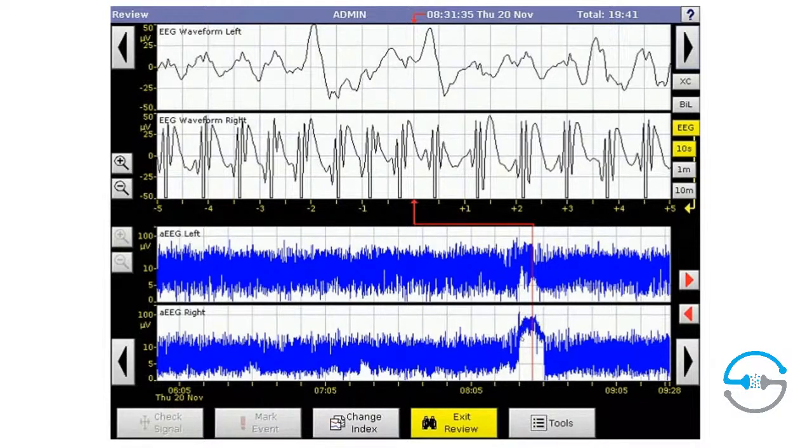But you can see that the amplitude, total amplitude is increasing. This is what causes that crescendo at the top. And then the amplitude begins to decrease. The differential between the highs and lows still stays very small. And so we have here this narrow bandwidth that then extinguishes and goes back to baseline.